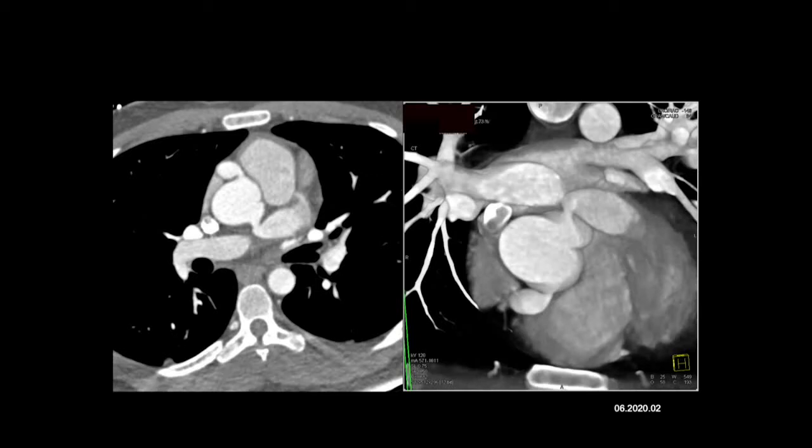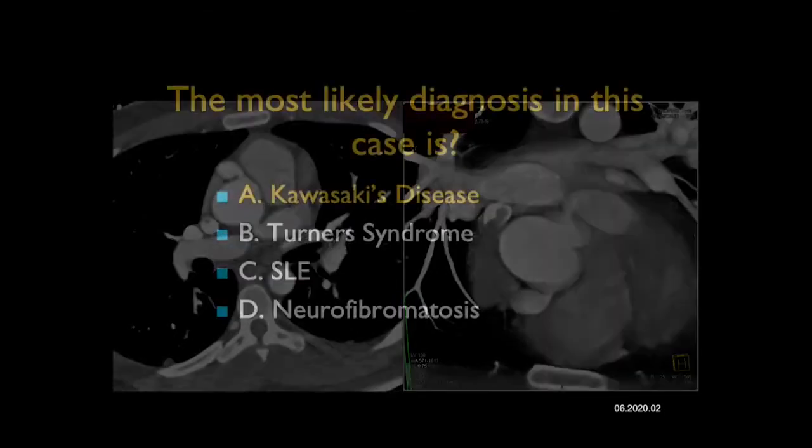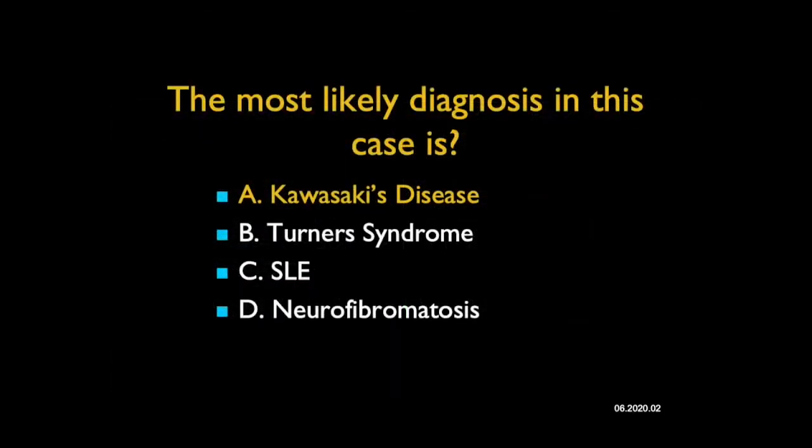Multiple aneurysms, and you can see that in a 1 or 2 year old as well. But again, these can easily balloon out and they can rupture. So these patients, as in this patient, will have surgical resection.